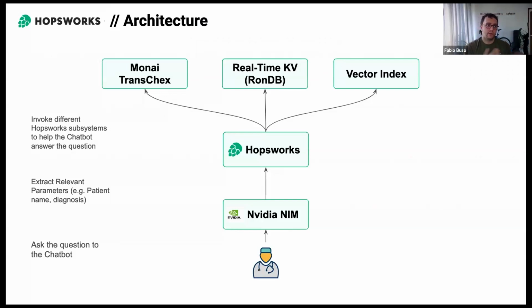We have registered all the functions that we need to be able to operate and answer all the questions that the doctor might have around the X-rays. Those questions and those functions are managed by Hopsworks, and they are registered with Hopsworks as part of the versioning scheme that we were mentioning earlier, to make sure that we know exactly what kind of questions the chatbot can answer, and what kind of functions, and the description of the function and things like this.